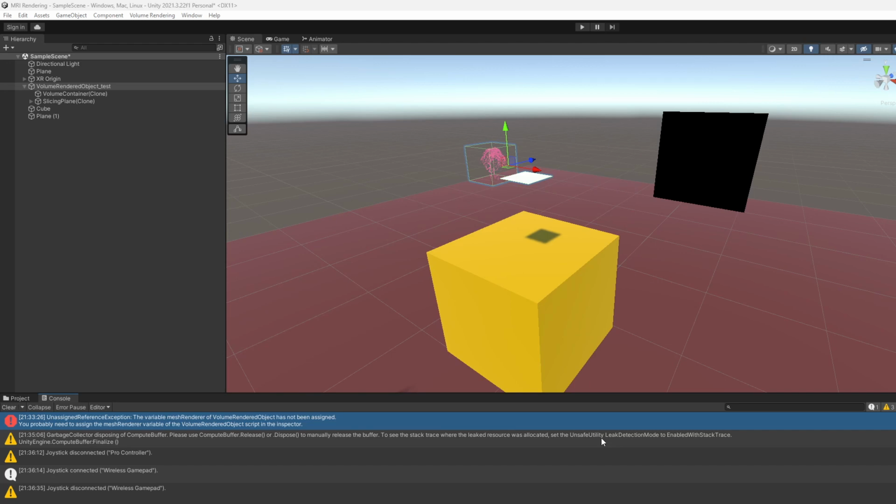I'm John O'Lardy, and this is my final presentation, or demo, for my augmented reality project. My project was to do with interacting with MRI data in VR in hopefully a more naturalistic way than is allowed for on traditional flat screens. I've chosen to make the project in Unity because it's got pretty good VR support, although it's a bit finicky to set up. Once it's set up, it's pretty good, much like anything in Unity.